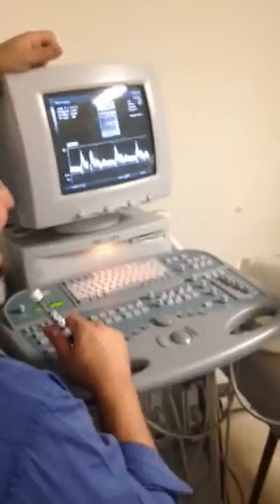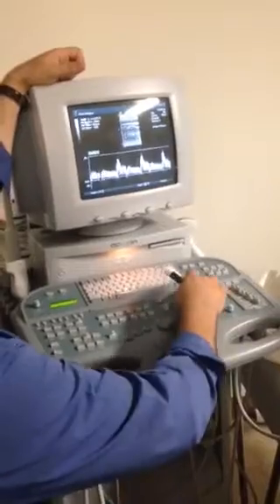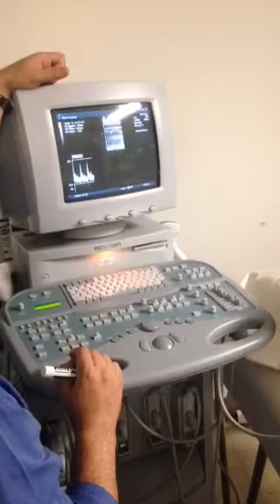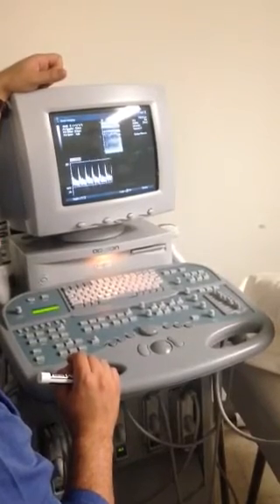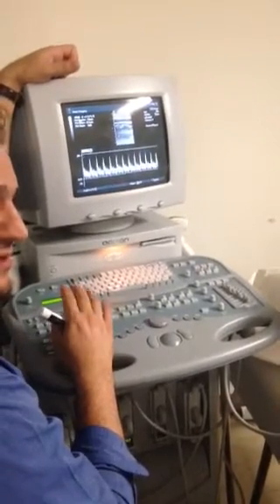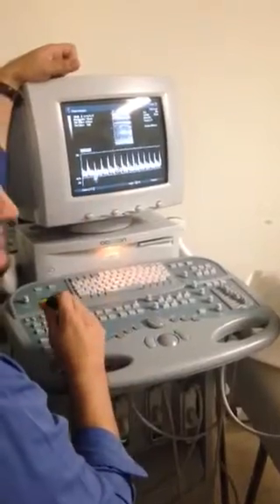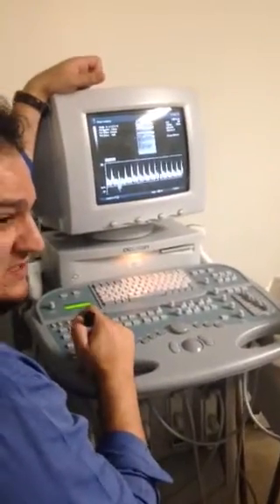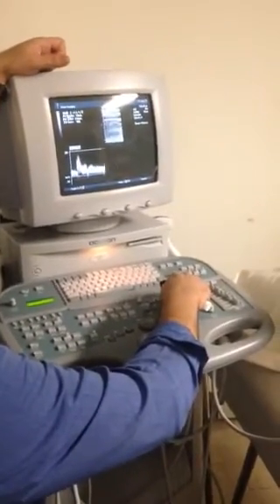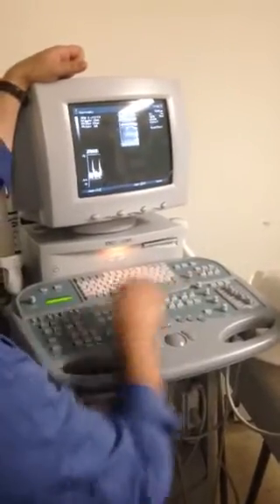All right. Look at this one here. It's too fast? Yes. I'll slow it down back to normal. It's called sweep. But do you want it this way? No. It's too slow. This is in case the patient has bradycardia, the heart is pumping really slow. No, this is when they have tachycardia, when they go fast. That's how it appears when the patient has tachycardia. If the patient has bradycardia, it's going to go like this. Okay? Now, let's go back to normal.